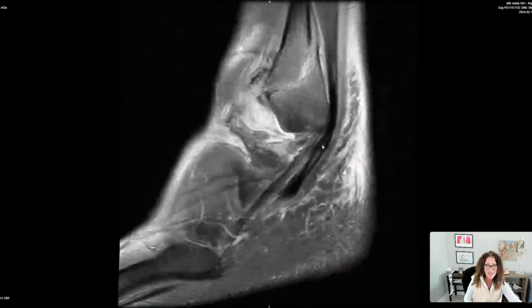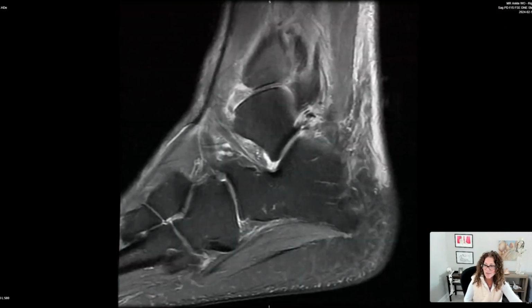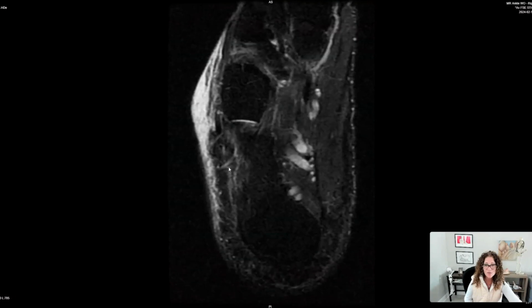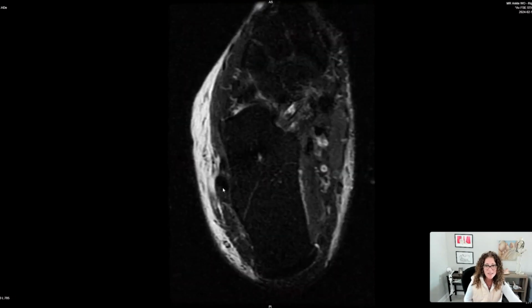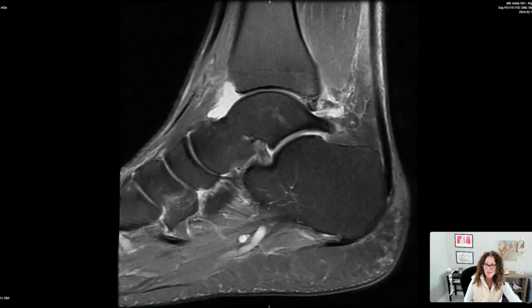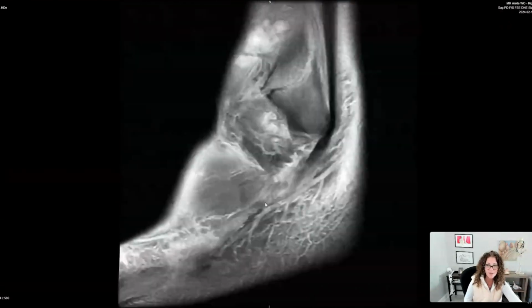It has some kind of elevated signal intensity in the inframalleolar region. And then, of course, going to this, let's take a look on STIR. Now, this is a great place where STIR will help me to understand, are those signals true that I can see? And I do find that there is some degree of mild tendinosis of my peroneus longus, but the majority of what I'm seeing there would be on the order of some magic angle phenomenon.